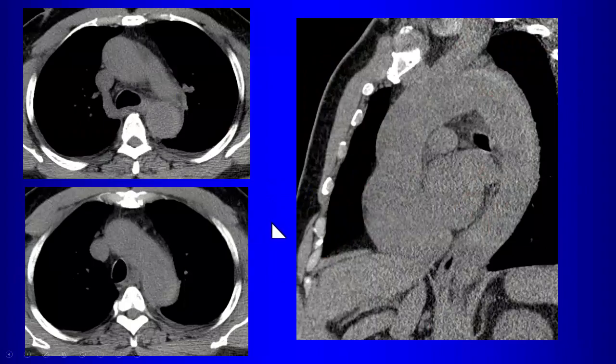Okay, so this patient presents with acute chest pain, and we do a workup for acute aortic syndrome. We always start with a non-contrast CT, and this is another reason why we like to do that. So why do we like to do that? You check for the hyperdense crescent. Yeah, so there's the hyperdense crescent sign indicating intramural hematoma. So this patient has an intramural hematoma here. This can be pretty subtle, okay?